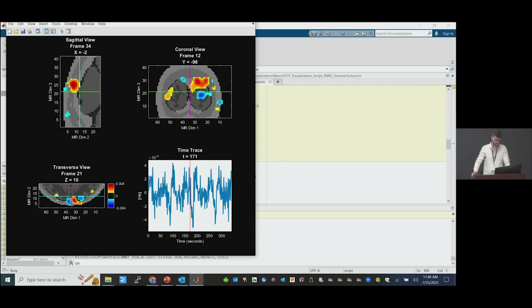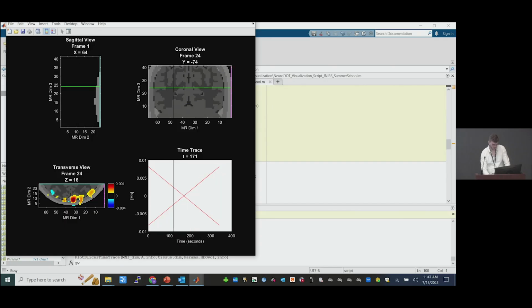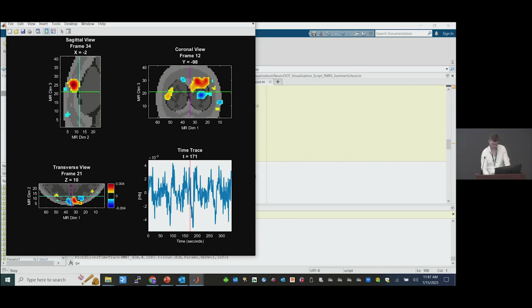And here we go for that. So we can start here. Where's my crosshair? Let's hone in right here. And then you can kind of just mess around. And as you see, if I click off somewhere that doesn't exist, my crosshair was in a bad placement, it just shows up as an X because I'm no longer in the brain volume. I can just reset right here.